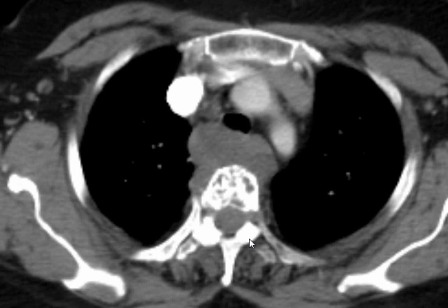We said three findings. If we don't see the other significant finding, and we don't report it, this patient will die in surgery.